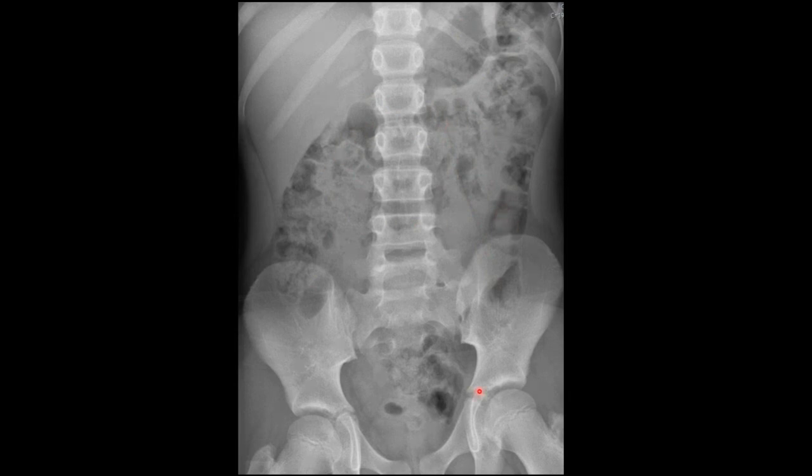Something to be aware of in patients that need a catheter put in: sometimes you can have distended bladders that come right out here. They are quite dramatic and large, and you've got to be careful not to confuse them with things like ovarian tumours in women, like a malignant tumour. It's just a distended bladder. And if you put a catheter in with those patients, it'll obviously come down. But just something to be aware of. But on this x-ray, we're not seeing any abnormal soft tissue masses.